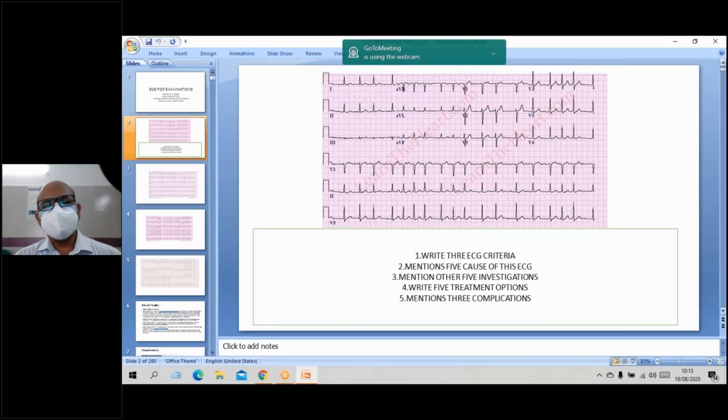So your diagnosis is atrial fibrillation. Atrial fibrillation. So this is the commonest disease. You will face it in all areas. So atrial fibrillation is very important. No student should miss this ECG. This is atrial fibrillation and this is commonest. Very good.